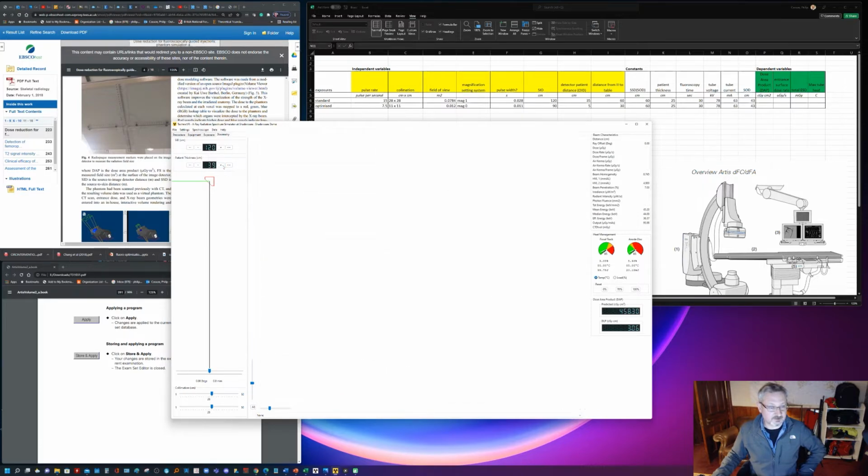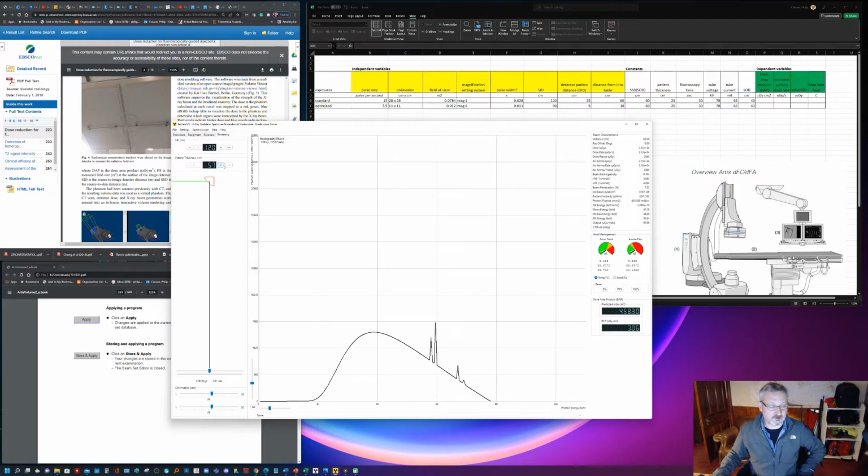So we'll have to plug that one in there. It assumes there's no gap between the patient and no thickness of the table and all that, so you have to add all that into patient thickness on this simulation. So 120 and 60. Now collimation, it says 28 centimeters by 28 centimeters, and it is already set to 28 by 28, so that's good. So I think that's this screen complete.